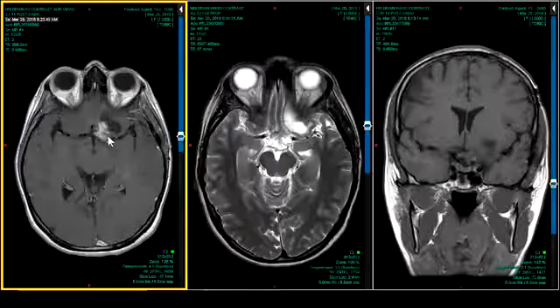But here's something that kind of looks like it, but not where you think it's going to be. I've seen one supratentorial hemangioblastoma in my entire life. So if you're making that diagnosis in the supratentorial space, you better think twice about it, even though they resemble each other in the posterior fossa quite a bit. So the fact that this is supratentorial is good news for you in terms of differential diagnosis.